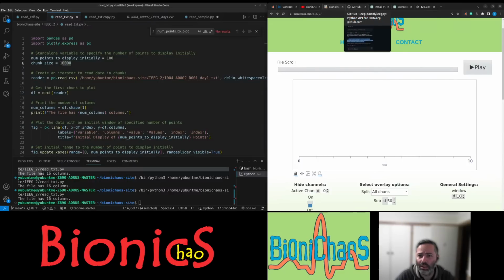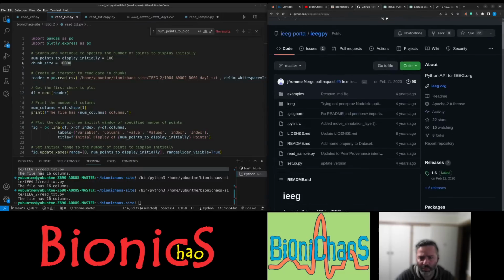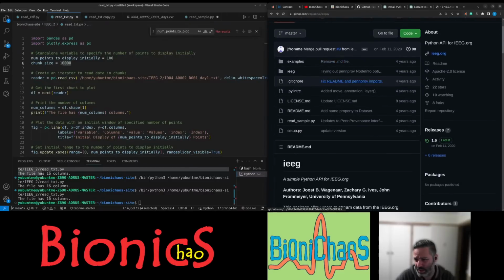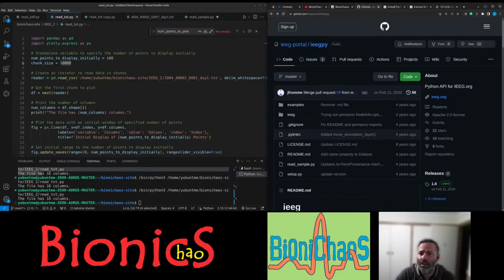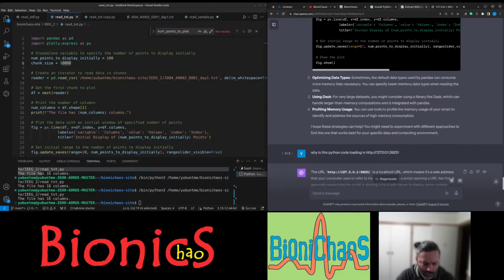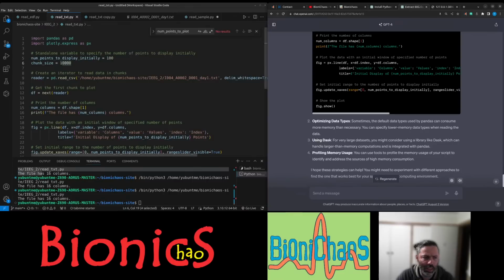That thing we tried from GitHub, the Python one, didn't actually work, so we might as well close that. Currently we're just using a text file because we exported the data before. Not sure, I think I have to log in again.